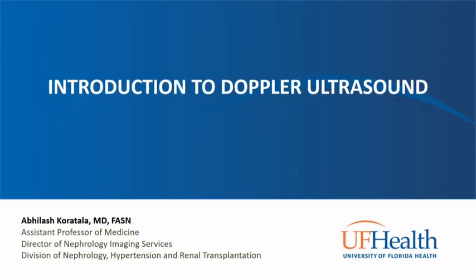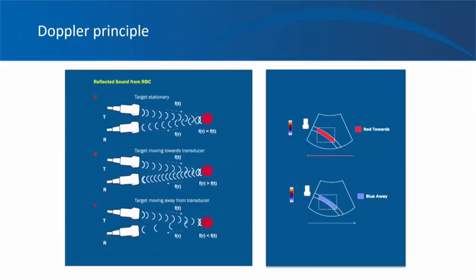In this video, I'll talk about the basics of Doppler ultrasound as it pertains to nephrology-related point-of-care ultrasonography. And the Doppler effect enables ultrasound to be used to detect and quantify blood flow. It is based on the frequency shift between a moving sound source and the observer.